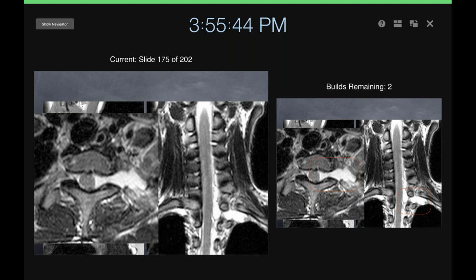What you see is the cord is shifted to the opposite side, and we see no nerve roots at these levels. And we have all this CSF going out through the neural canal, collecting externally, as we can see coming out through there.